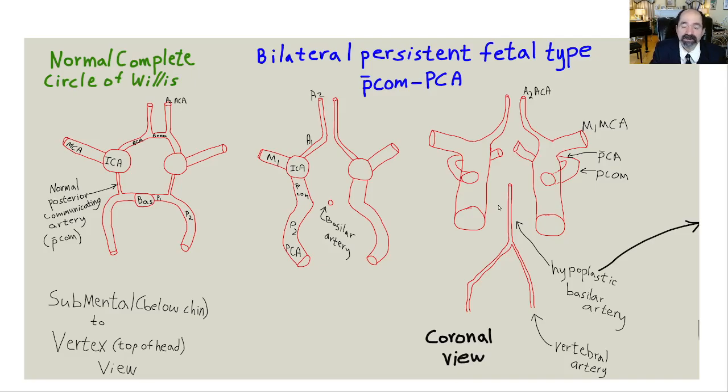You're only going to know it if you do an arteriogram: catheter arteriogram, CT arteriogram, MRA arteriogram. You don't know if you've got it. And it's common enough. Okay, I see these every day. And every week I'll see a brainstem, either silent infarct, ischemia, or frank infarct, or cerebellar infarct. See them every day.